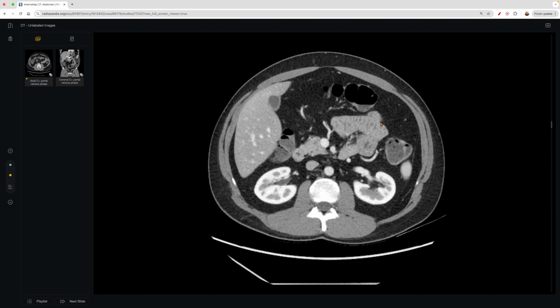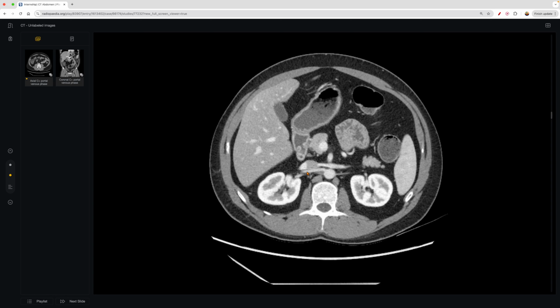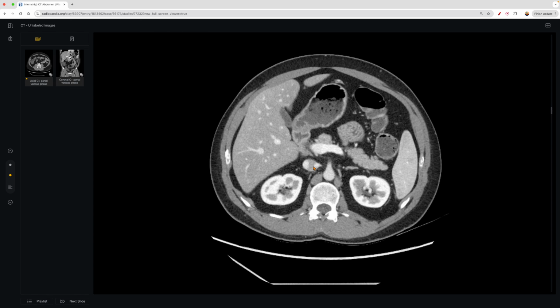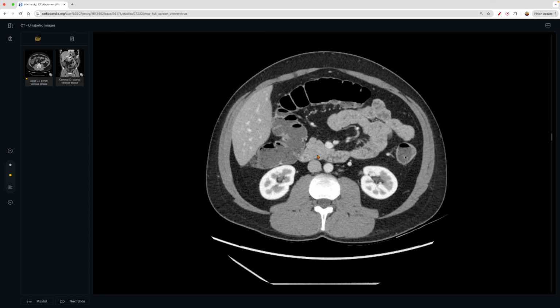And also, you can see the haustra on the colon here as well, the transverse colon that we're seeing coming across the gallbladder, the liver, and then of course the kidneys, and then we can see the arteries as well connecting to the aorta. So identify the aorta and then trace that out and go from there. And then you have the same idea for the inferior vena cava as well. And then you can see the pancreas.